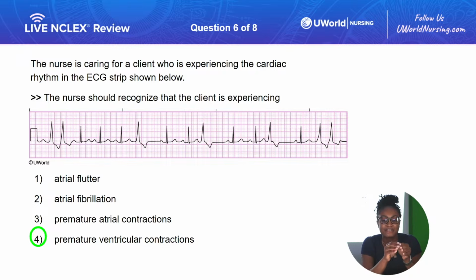This is when you have variable heart rate, especially when the R to R interval is not consistent. I don't know if I'm lining up, but the 2 over there and the 2 maybe behind my head, those are the premature ventricular contractions. They're wide. They don't look like a normal QRS wave that you see here in the middle. And it doesn't accompany its own P wave. That P wave gets mixed in with that QRS wave, which is why it's looking so wide and bizarre.